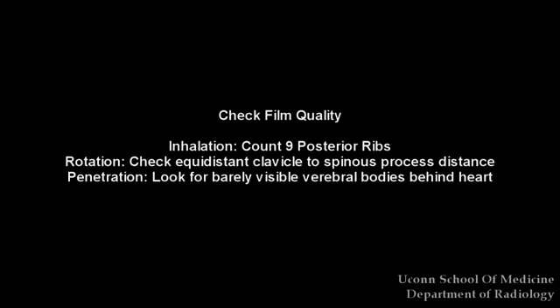Let's run through reading a normal chest x-ray. First thing, ensure that you have the correct patient film. Make sure that the patient's name, date and time the film was taken, and film ID number match what you're looking for. Do a quick survey for technical quality. Look for proper inhalation, signs of rotation, and correct penetration.